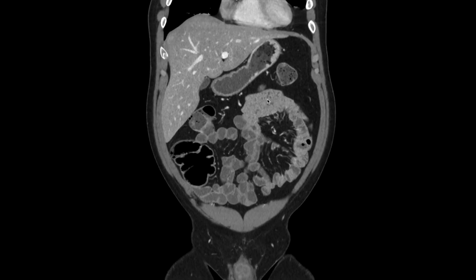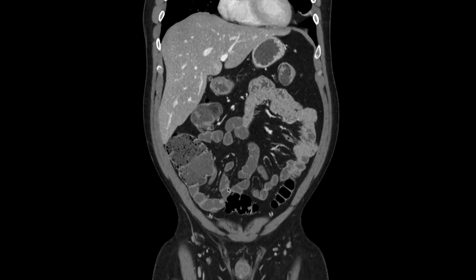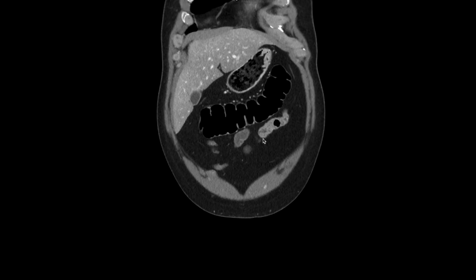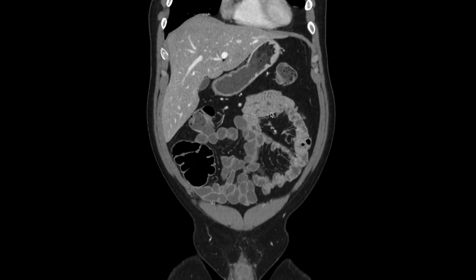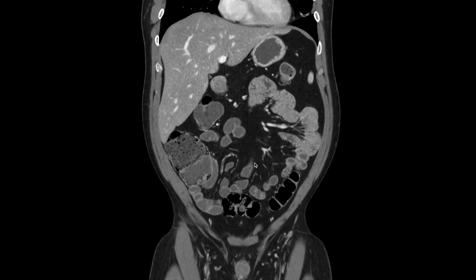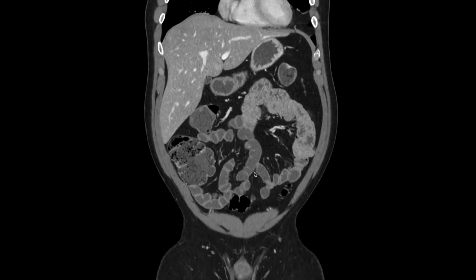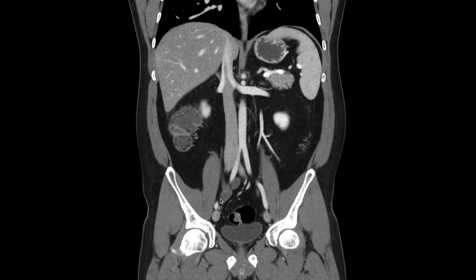and into the jejunum with this typical feathery fold pattern compared to the relatively smooth appearance of the ileum more distally. And the coronal really provides a great look at a large portion of the bowel at once. You can see this whole segment of small bowel, so I'll run the left abdomen back and forth, in the middle, and then to the right. And that gets a really good global view of the whole small bowel caliber, any abnormal thickening or enhancement, or any masses.